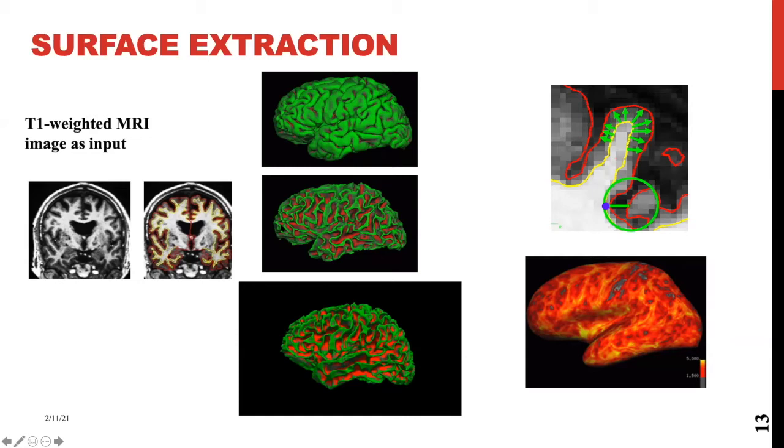Then if you think about building on top of that, that's what gives you this pial surface, or the cortex. This gives us insight into the sulci of the brain, whereas this gives us more of what we think of when we think of a brain. And then it also generates heat maps that you can view your data in or do analysis in.